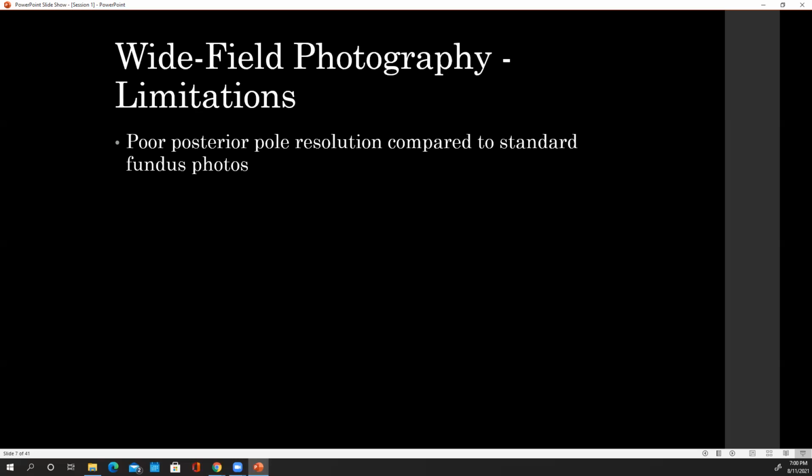Did you mention how many degrees the standard fundus photo can give you? Good question. Normally it's around 50, right? And so, you get these, and then when you move it around, you do your standard, like this ETDRS. I believe the ETDRS was classified at 30 degrees, and then they moved it in seven different locations to create that kind of sideways Mickey Mouse sort of image that you saw, where they're all connected. In this case, I think it's 50 degrees, but of course, when you do a montage, you can get those 7 standard fields, maybe a little bit wider.